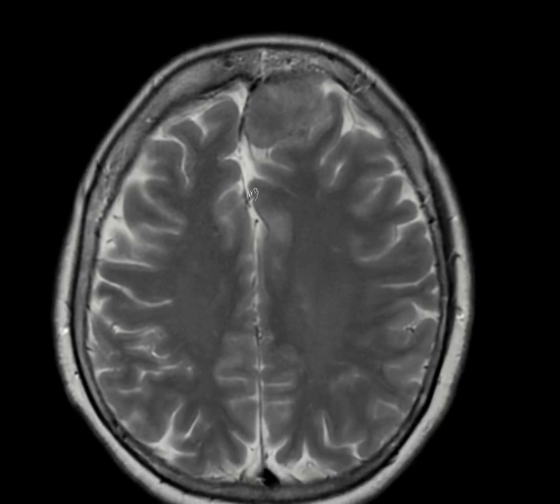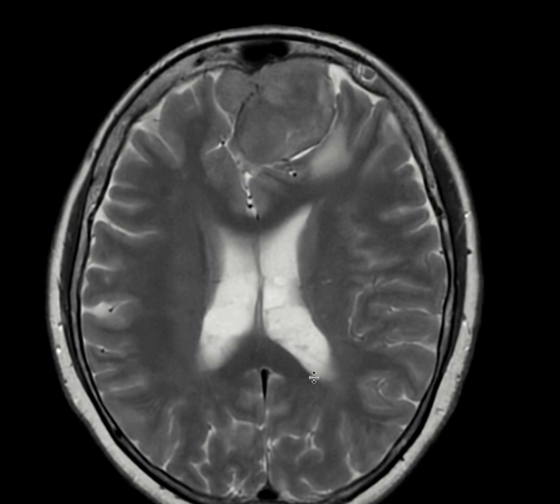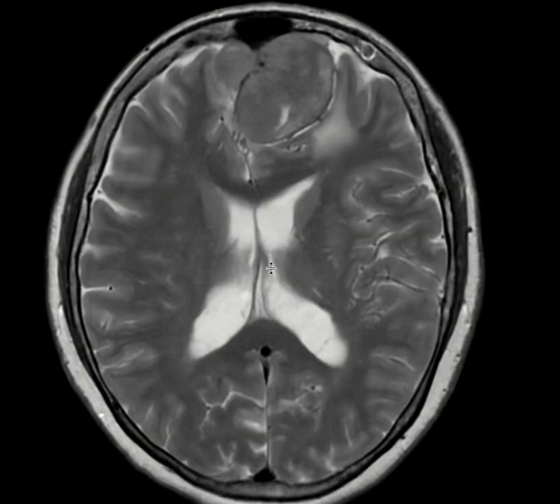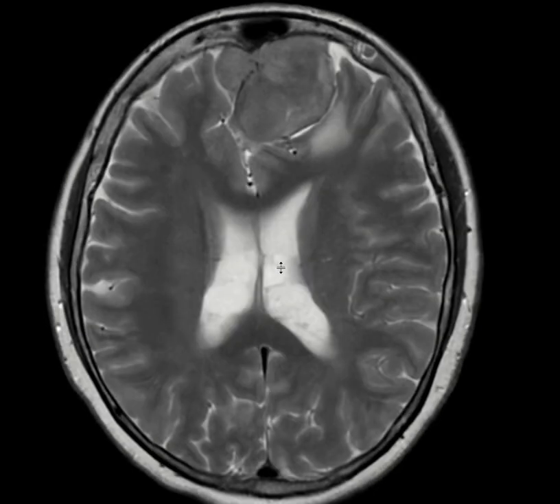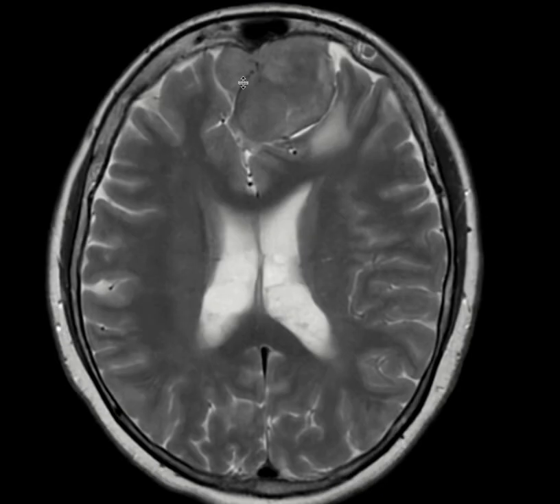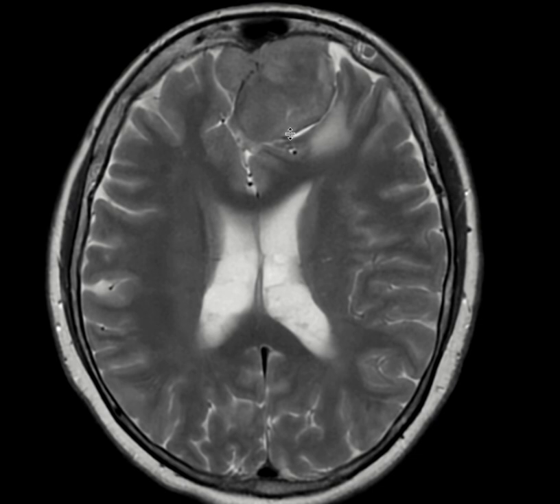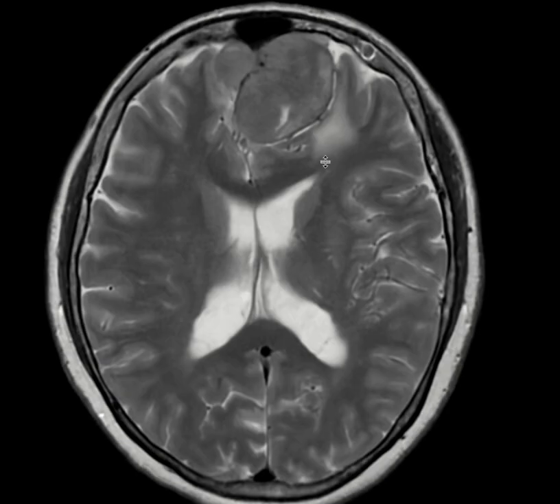Okay, let's focus on this lesion that we see. This is a T2 sequence, because we have the CSF bright in the ventricles, and you see that the scalp is also bright, because the fat is bright. So I know this is a T2 sequence. I see a lesion. Actually, I see two lesions in the parafalcine area of the frontal lobe, and they are predominantly T2 isointense. And I see a little bit of edema in the adjacent brain parenchyma.